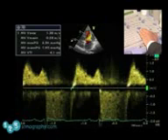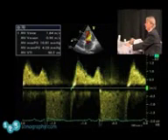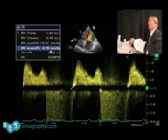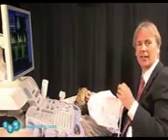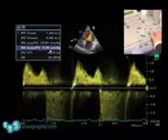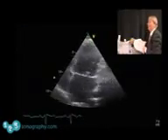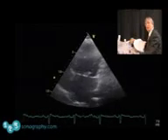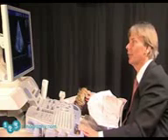The next thing we'll do is take a look at the mitral valve curve and try to quantify the gradient. So I'll contour the curve here now. And look at the mean gradient, which is 4 millimeters mercury, practically no gradient. So in summary, this patient has a typical rheumatically affected mitral valve with rheumatic stenosis and with a very low mean gradient and a mitral valve area above 2 square centimeters. So it's certainly only mild.